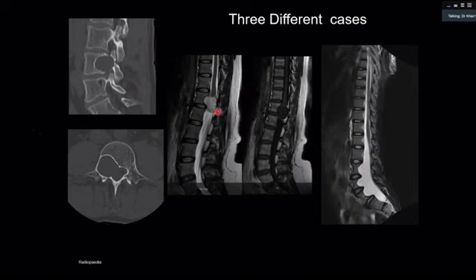And it was, the differential will be a schwannoma or a neurofibroma. This case, again, is similar to this case, but this is a CT scan. It is not the same case. And it is also schwannoma slash neurofibroma. Of course, you don't have evidence more than that. Okay. Right. Actually, this was the last case of the day.